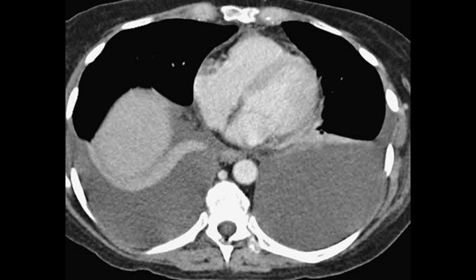Decubitus films are very useful to confirm the diagnosis, as free pleural fluid will layer along the dependent side. The lateral decubitus view is more sensitive than the upright film and can detect as little as 10 milliliters of fluid, compared to the 175 milliliters usually required to blunt the costophrenic angle on an upright view. In this case, the effusions are bilateral and likely malignant, given the background of peritoneal carcinomatosis, which can cause transdiaphragmatic spread of fluid or pleural seeding.